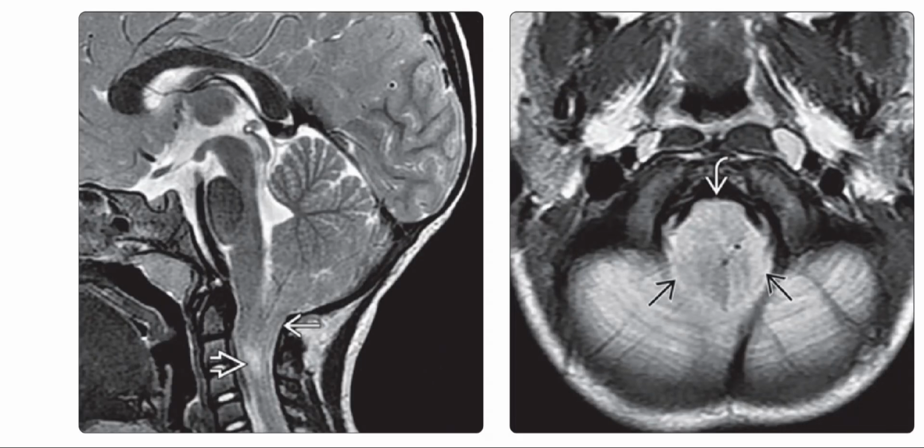On the left image, there's a sagittal T2 weighted MRI, and it demonstrates severe cerebellar tonsillar ectopia. The tonsils produce deformation of the upper cervical spinal cord and abnormal cord T2 prolongation, which is reflecting edema and potentially an early pre-syrinx state. The right image is the axial T2 weighted MRI sequence, and it reveals the caudal extension of the ectopic cerebellar tonsils into the foramen magnum, completely effacing the basilar cisterns and displacing the adjacent spinal cord.